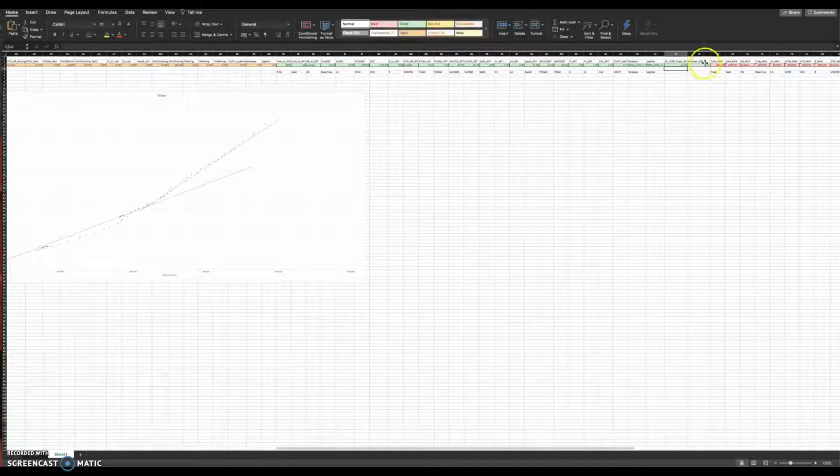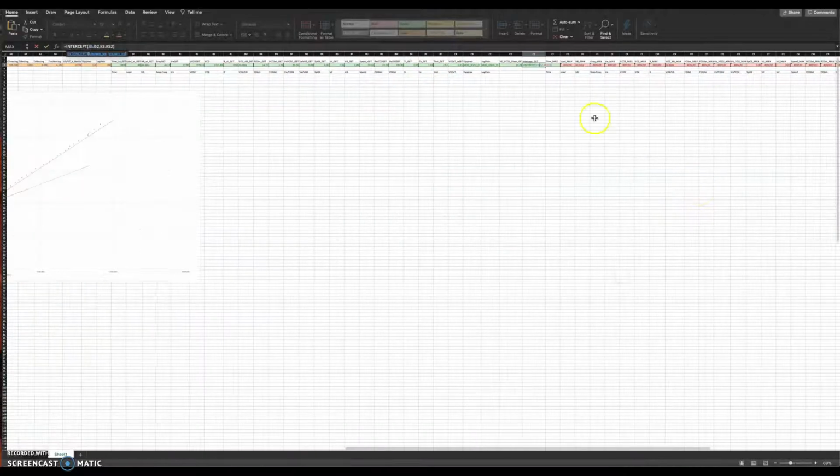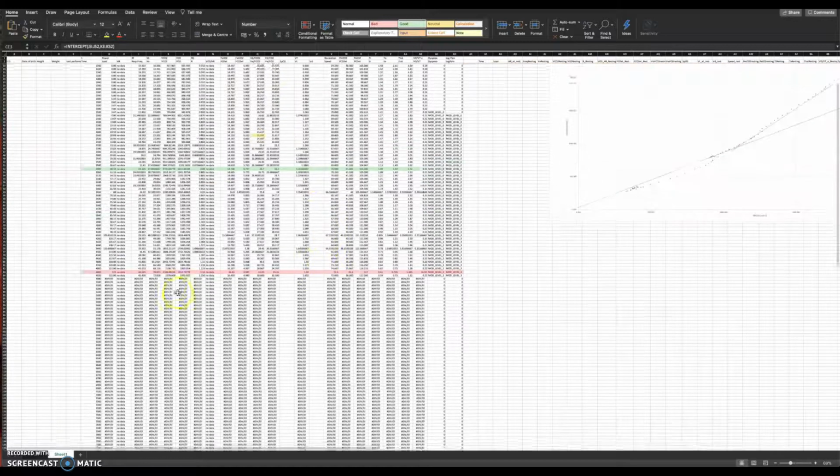And then the intercept is doing a similar thing. It's drawing a line of these two here, but it's calculating the point where this line, if it were to continue on beyond these points, would intercept the y-axis. Obviously that's dependent on how steep the line is. If the line is really steep, then it might be a negative figure. So what's our intercept here? It's 2.13, so it's a positive figure. I think that's really healthy.